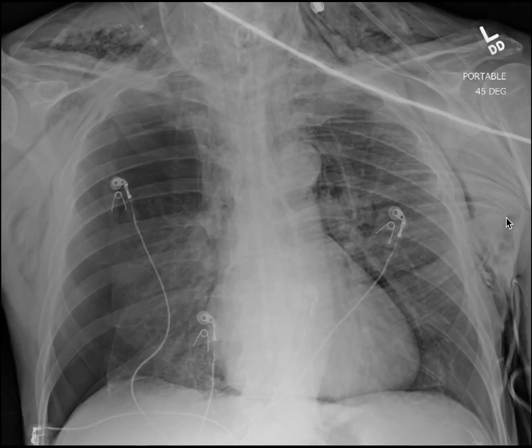Whenever you see this in this clinical scenario, you must assume that there is also a pneumothorax on this left side as well. So bilateral pneumothoraces. Granted, this one isn't as big as the one on the contralateral side. All right, now, if you notice that there is a black stripe here, that's very astute. This looks like pneumopericardium, but I'll tell you that there was no pneumopericardium here. This is just that extensive of subcutaneous emphysema that is scattered, and it's giving it this appearance.